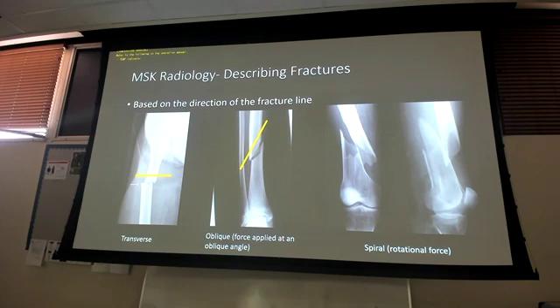So I thought we were trying not to get hung up on guessing if we don't have an indicator. So if you flip it, would the femoral head go into the pelvis? If that picture was flipped, if we're looking anterior right now and flip it posterior, isn't the femoral head still gonna go into the pelvis? No, this is how you're looking at the patient, right? So if I gave you just the pelvis, you would have enough to turn around and look at. Just think of the anatomy, right? Even if it's flipped, the anatomy is not gonna make the pelvis kind of come over here.